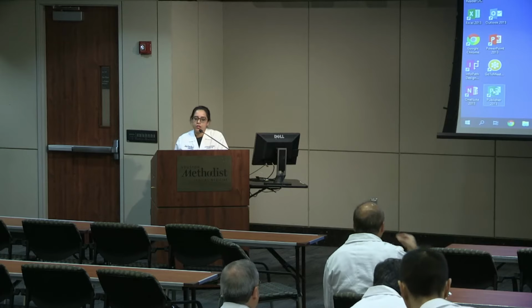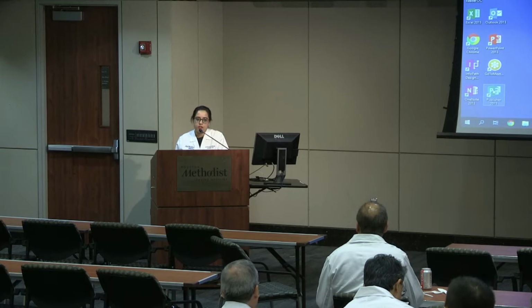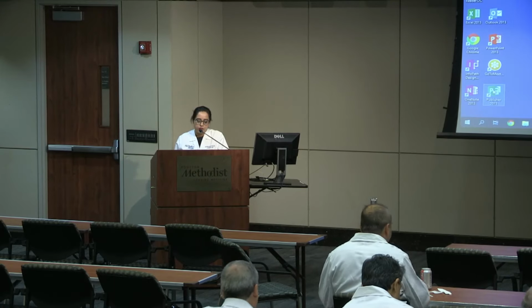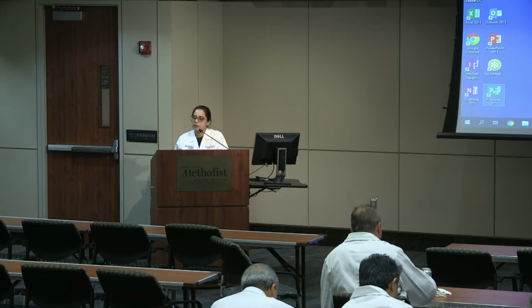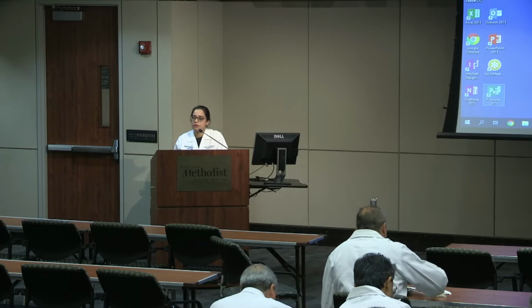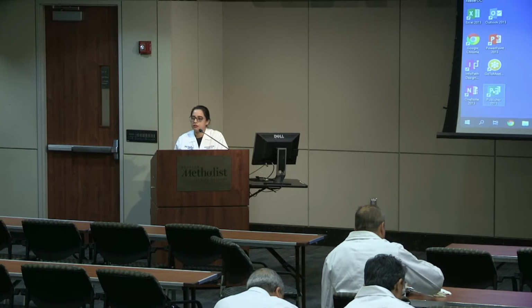So the question I really want to pose to the audience today, and Dr. Nagueh and the imaging folks here, is whether we should use those parameters instead to determine aortic regurgitation accurately in patients with LVAD, because it's widely different from the clinical parameters that have been previously used.